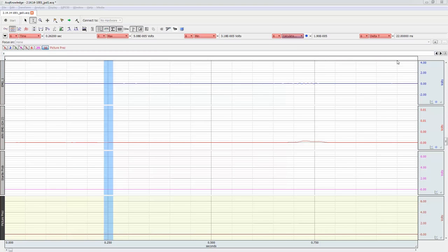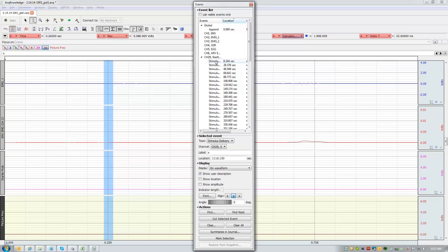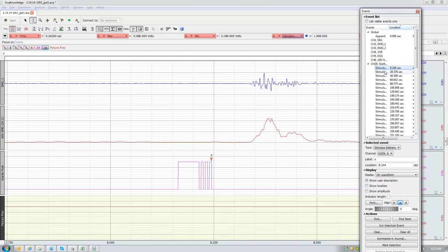Okay, to make analyzing each trial more efficient, I'm going to go all the way to the right here and click on this where the left and right arrow is, one more over, and this will pull up my individual trials. Now I can just click on the trials where we laid down markers, which was shown in the previous videos. It can go straight to that trial, so I don't have to hunt around for the specific trials I'm looking for.